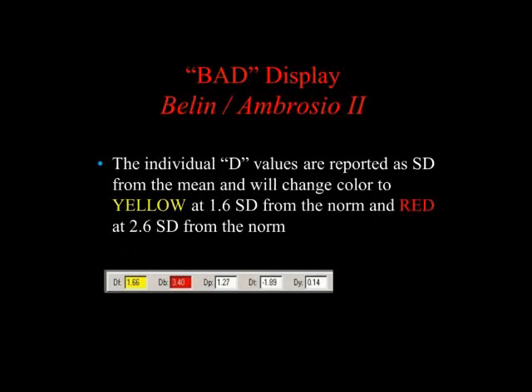So each of those parameters is reported as a standard deviation. If you look here at the bottom, you'll notice that the anterior surface change represents a change that's roughly 1.66 standard deviations outside the norm. Notice the back surface, 3.4. Pachymetric progression, thinnest point: a minus actually means it's very normal. And this is displacement of the thinnest point.